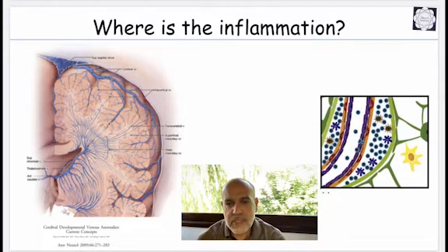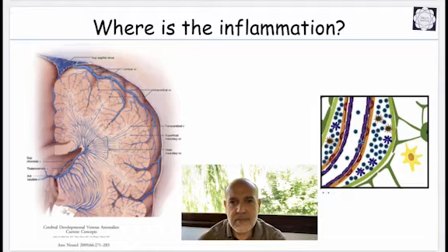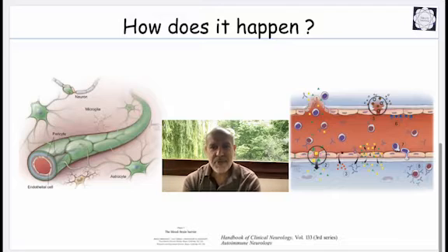But anyways, what we are seeing is gadolinium at this specific compartment, and we have to understand that this is not the target of the inflammation. This is just a gateway through which certain cells and substances such as chemokines and cytokines get access to the brain. This is like the first battle of the inflammatory war. Okay, but what is happening here?